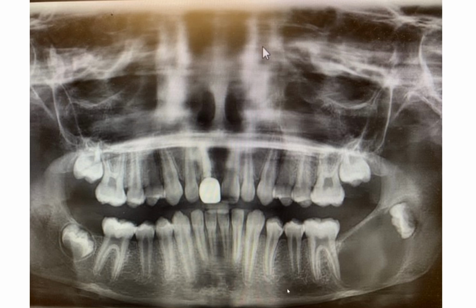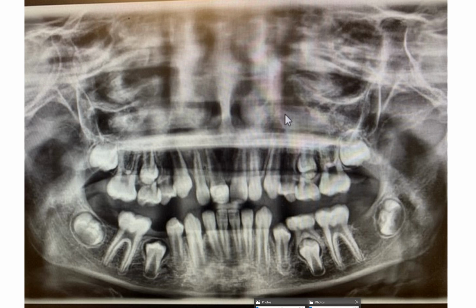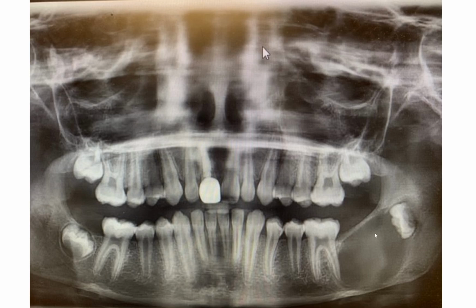But now that I have the benefit of having this original radiograph, I wouldn't have considered dentigerous cyst because it's not directly involving the follicle of a tooth. Now looking at the second radiograph very carefully, you know that the dentigerous cyst should attach at the level of the CEJ, and I think you can make an argument here that this radiolucency appears to end at the level of the crown rather than extending to the CEJ, and that's also the case here as well.